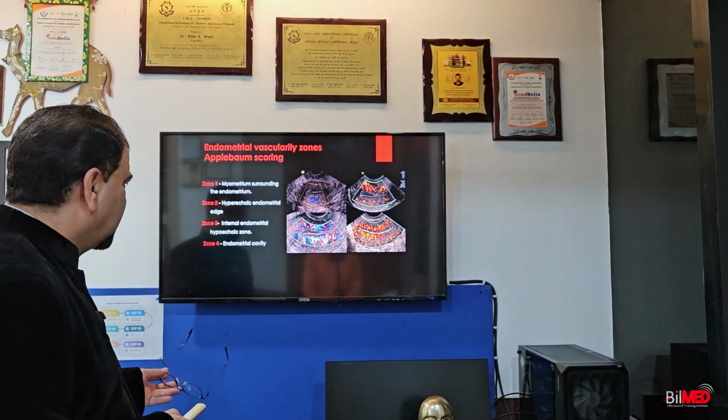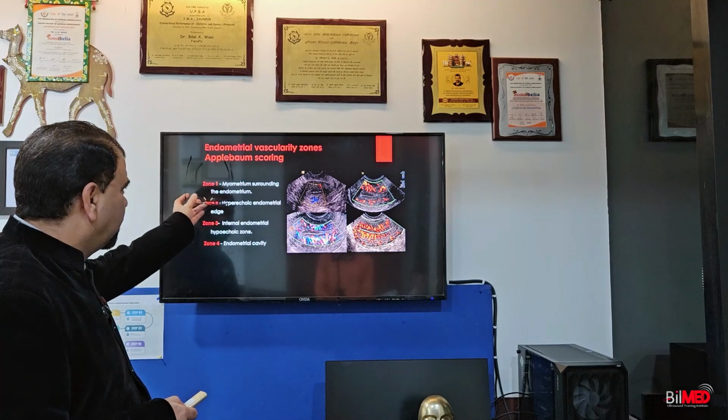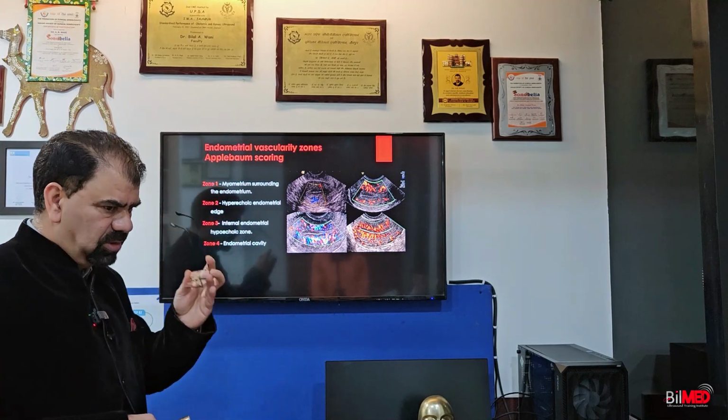Today, we will discuss one important topic, and that is the biophysical score of uterus. It is not the biophysical score of fetus, but a biophysical score of uterus, which is very, very important when you are taking an infertile scan. Now, before this biophysical score of uterus, I would like to give you the endometrial vascularity zones.